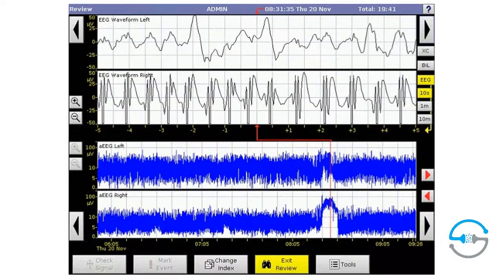So when those seizures are happening, the voltages are very similar because the pattern is so similar. And so the bandwidth becomes very, very tight and very narrow. And so that's what we see. Beginning, middle, and end, a crescendo, decrescendo, and then we see a narrowing of that band and upper and lower margin. So those are the features that we're always looking for on the aEEG.